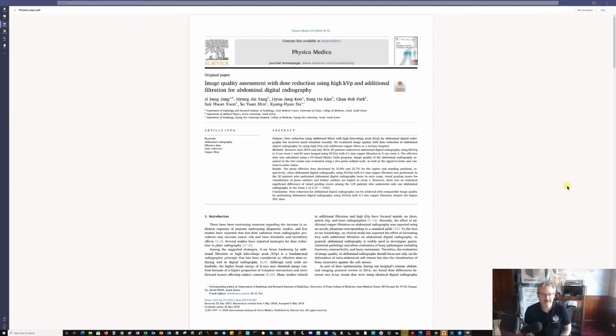In this video, we're going to use virtual radiography, ProjectionVR, to undertake an experiment based on this paper. We found this original research article in the literature, and my second year students at the university were looking into ways in which they could optimize radiographic techniques.